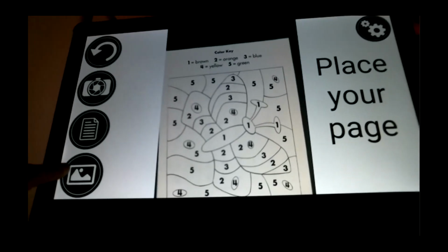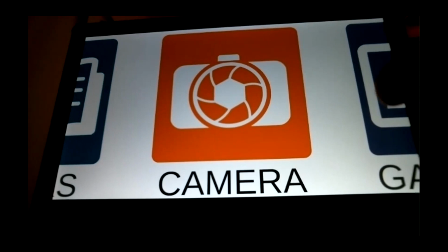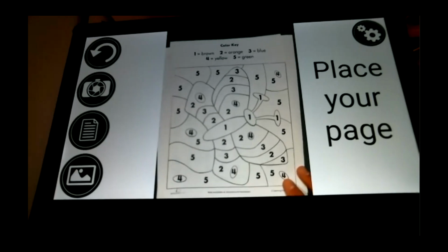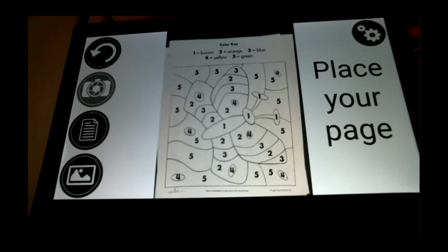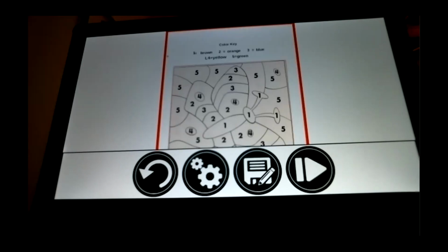Okay, so right now, just to show you this very quickly, I have the same look and feel as I had on my Connect 12. And instead of being called Magnifier, on the Reveal 16i, it's called Camera. Because the only thing I can do here, I can't zoom in. I'm just going to take a capture of what's underneath here, and then it's going to be stored in my gallery. So this is how it works. You can't zoom in or zoom out. It's only there to take a capture. It's not like the Connect 12, because the live mode is done with a different camera.